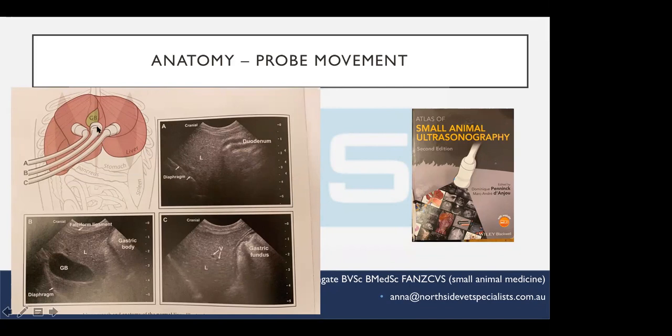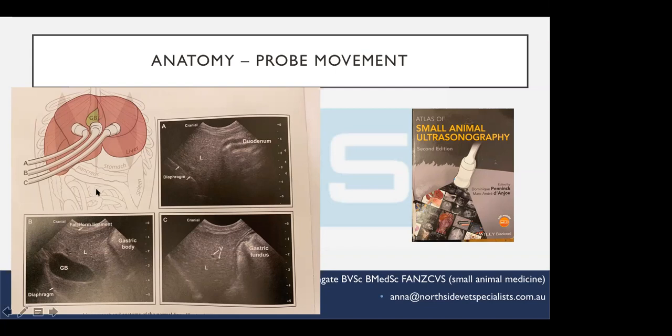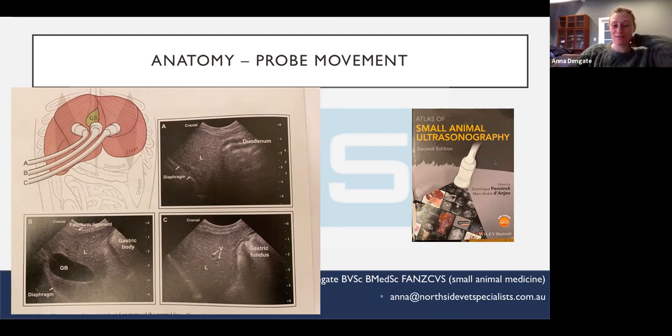So in this example, you definitely see liver on the right-hand side of your screen. You could probably say the liver extends beyond the costal margin. Okay, that's a better demonstration than my triangle hands. It's a hard concept, but I get it now. Well, it's a hard concept when I haven't given you the orientation of the patient, for sure.